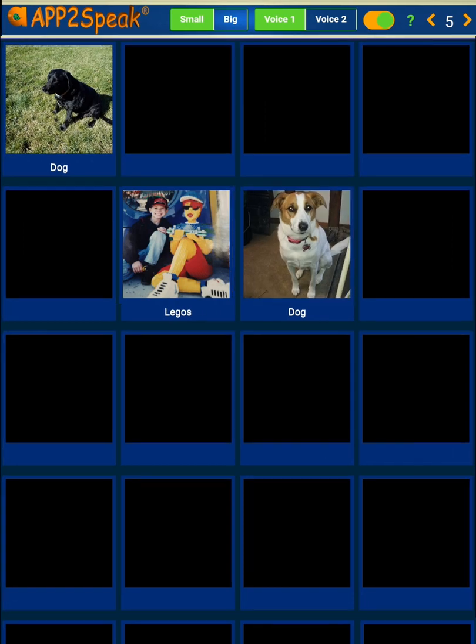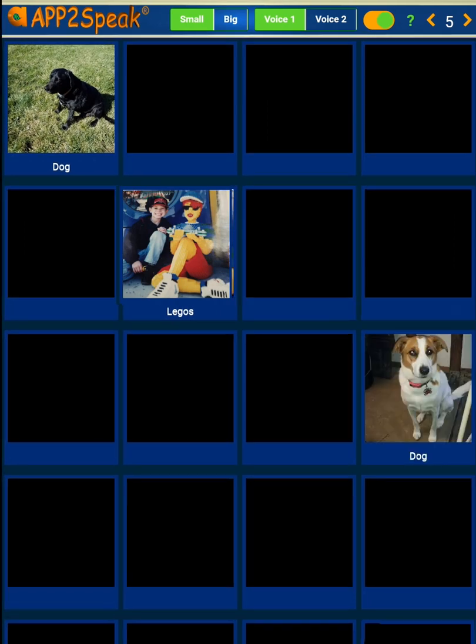To move custom photos, slide the green button over to the right to start the customization. Select the photo that you want to move and then the area you want to move it to. Custom pages can also be moved, and you need to turn on the customization button.